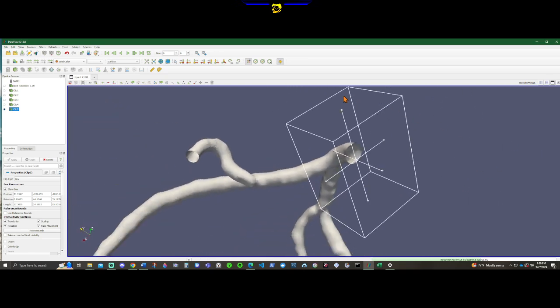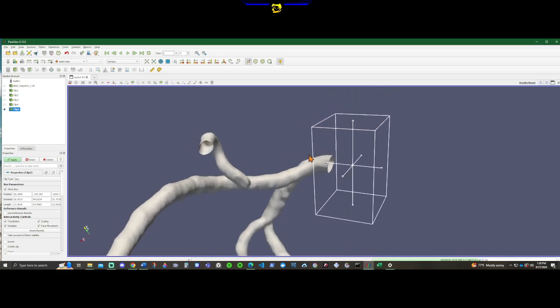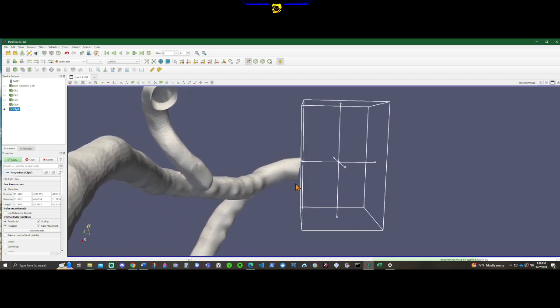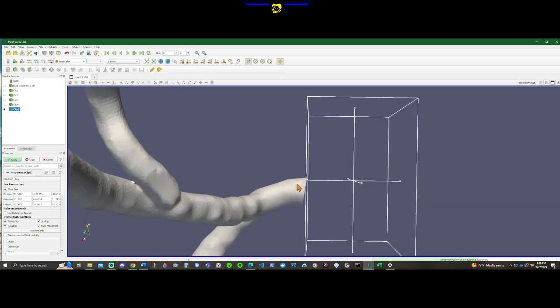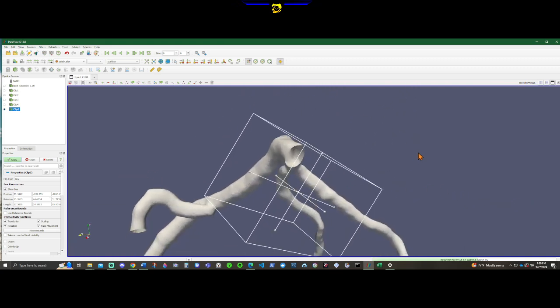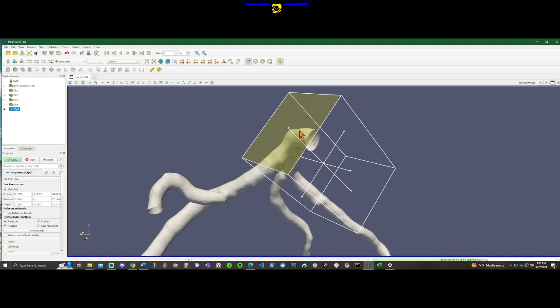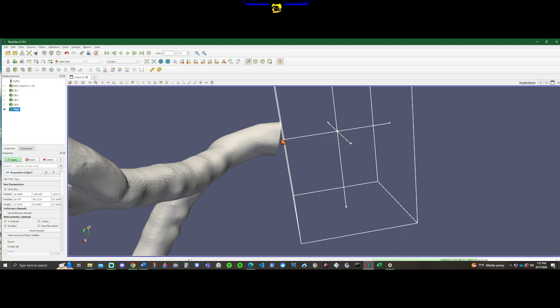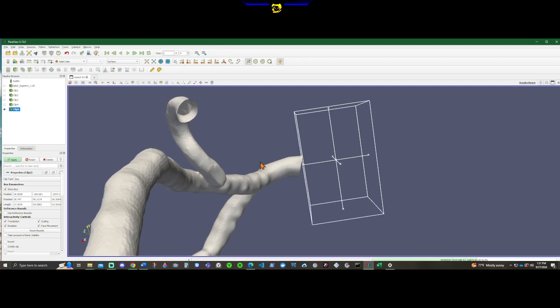So I'm going to push that forward a little bit. Yeah. See that? How it's like leaning forward? You don't want that. So you want it more perpendicular. So this again, it needs more. So let me push this a little bit more that way. Yeah, you really don't want something like this where it's at an angle. So now let's check in again.